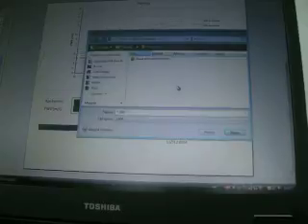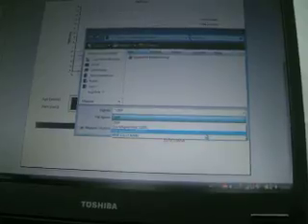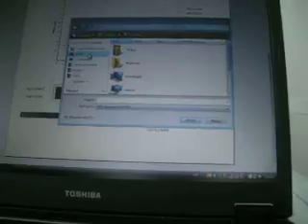Similarly to the other softwares of Tensiomed, you can save the report directly into a PDF now. I will do that onto the desktop.